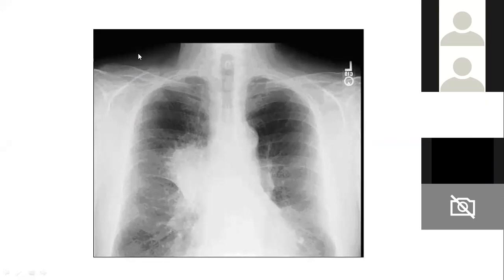Okay, so the confusion remains, correct? So I again told you the lateral margins are irregular. So that means there is an infiltration into the lung, and it's located in the region of the hilum. So on a chest X-ray, we can safely comment that it is a lung parenchymal mass, most likely a malignancy like a bronchogenic carcinoma. Okay, so again, this lesion, it was more straightforward. The angles are not that obtuse, and we can always make out the irregularity of spiculated margins laterally.